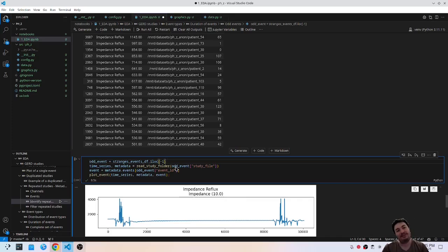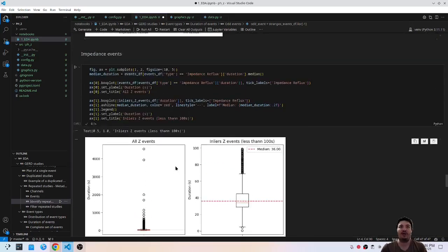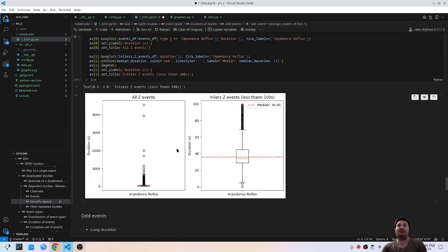So at the end it will be sampling windows inside this time series. A window of how many points? I would like to have a complete event in the window, or at least the majority of the events in the window.